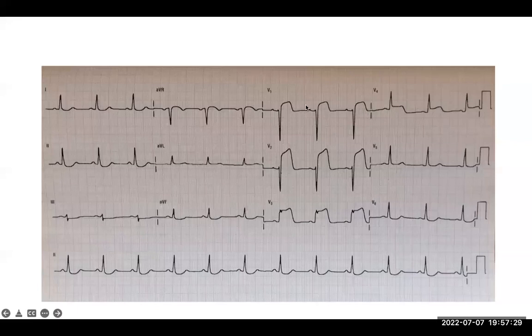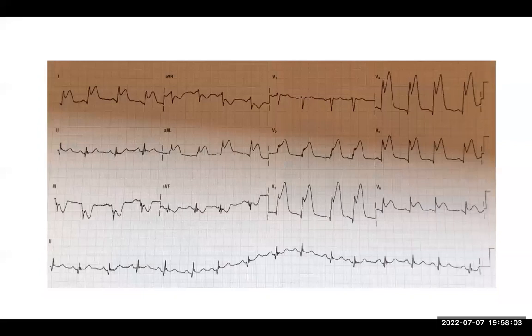So you cannot compare anterior ST segment elevation with an inferior ST segment elevation. So usually anterior segment elevation are more important, but does not mean that all the others are not important. So this is very clear ST segment elevation, V1, V2, V3. You can comfortably say this patient has an anterior ST segment elevation. You start your usual clopidogrel, aspirin, you give Clexane, you give atorvastatin. If you can thrombolyze, fine. If you can't thrombolyze, send that patient to a place where cath lab can be done and the vessels are opened immediately. Okay?